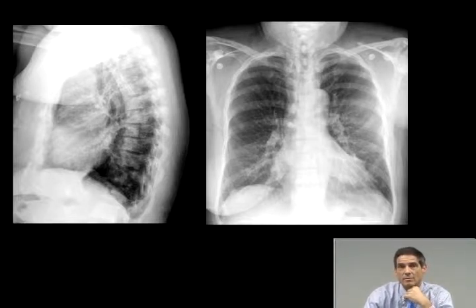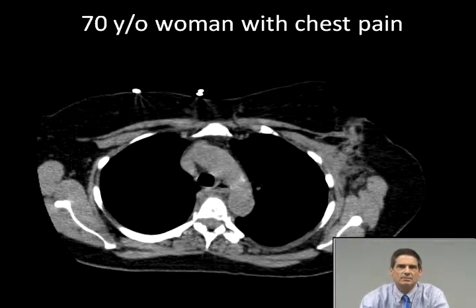The thoracic vertebral bodies are not really the right color. They're mottled and too dense. Her ribs, you could probably say the same thing about. Here's a chest CT that was obtained, and you'll notice how distorted the tissue is on her left side along the pectoralis muscle there. Again, she did not have a mastectomy.